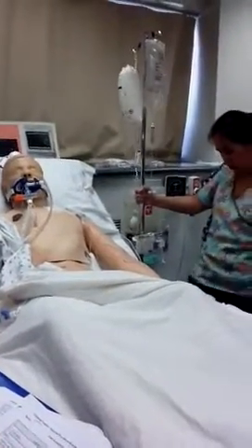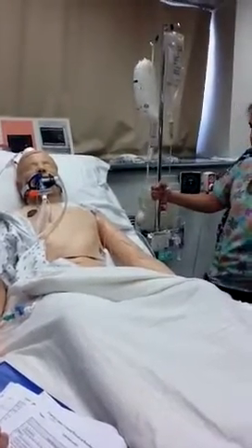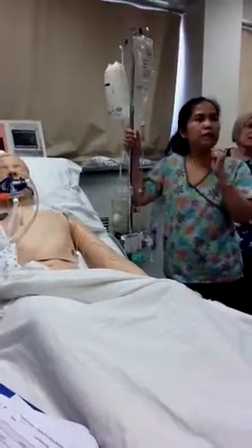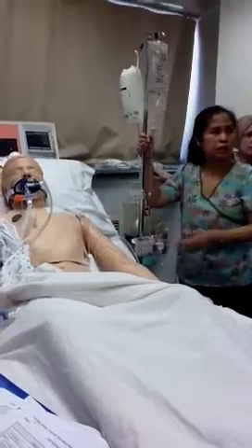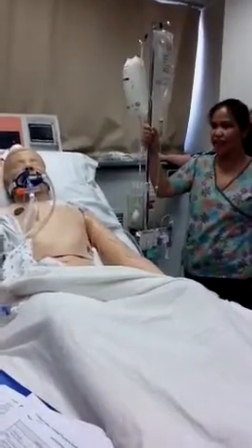But make sure, don't do it by yourself. It's probably going to be with your nurse or me. But definitely that's a sterile technique, changing the dressing. No, the dressing itself. We don't change the central line, that's a physician. That's what I meant. Dressing, yes. Okay. Any questions on that one?